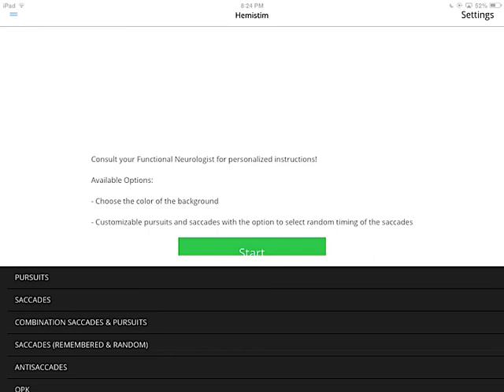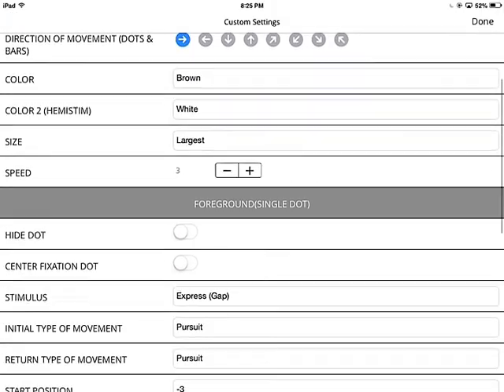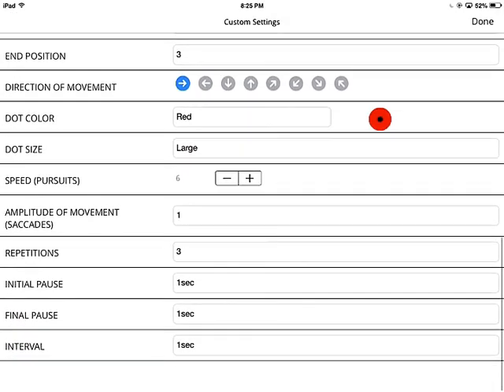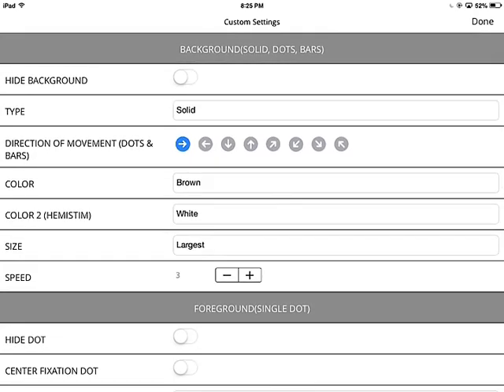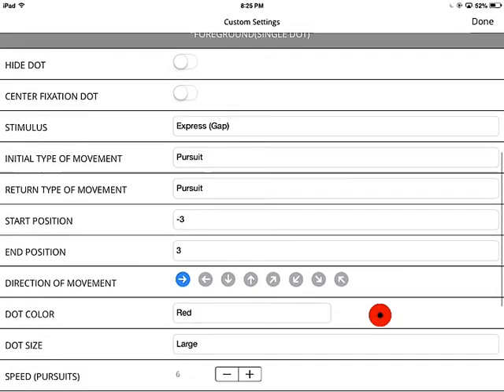And in here, finally, we've got the custom exercise, which have a background and a foreground. So you should be used to that with the current app. There's just some additional features here that have been added. Additional color, we've added brown to the colors. So this is really no different than what we just went over.